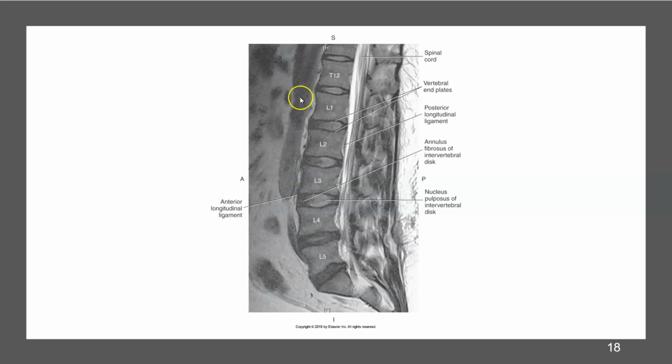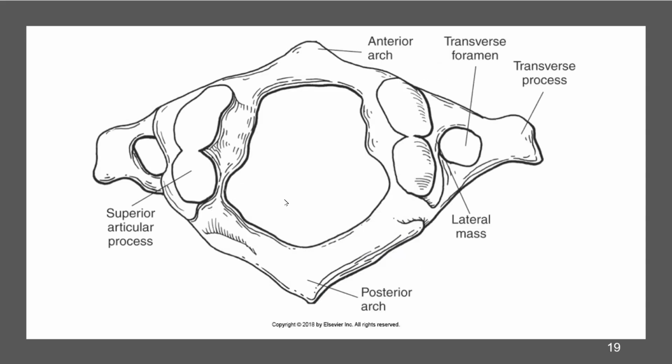This right here is the aorta. It's the thoracic aorta, abdominal aorta coming down into the pelvis. It bifurcates about here so that you see an end. We have a lot of the times caught aneurysms of the aorta on our lumbar spine scans.